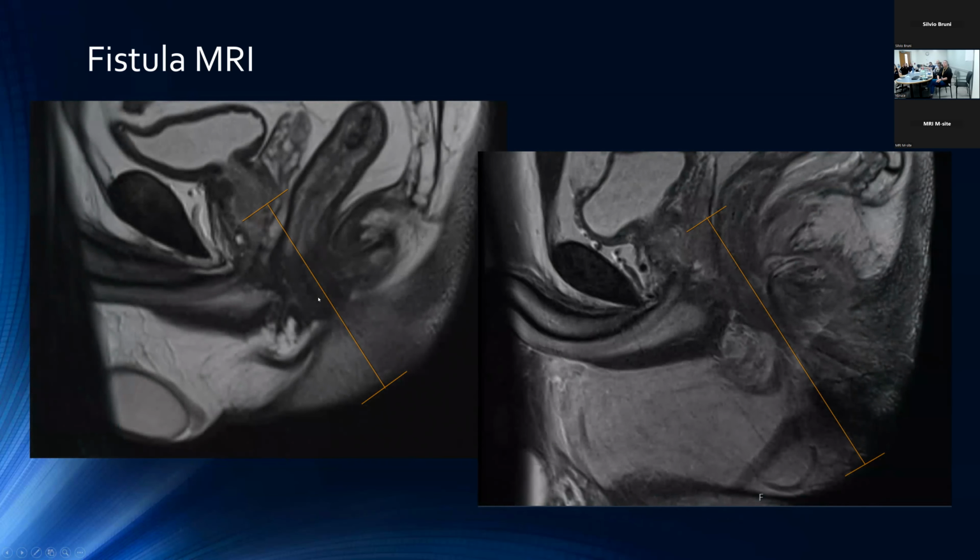So here on the left, you can see a line drawn through the anal canal, which is again oriented obliquely to the vertical plane, passing pretty much through the middle of the anorectal junction, that you can make out along that line between the pubic symphysis anteriorly and the sacrum, and then through the mid portion of the anal verge inferiorly.